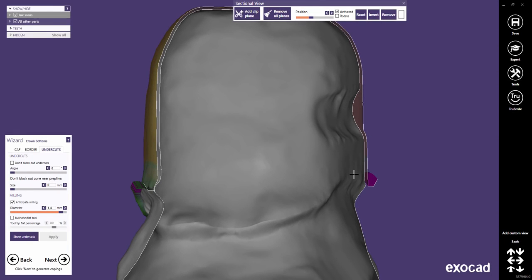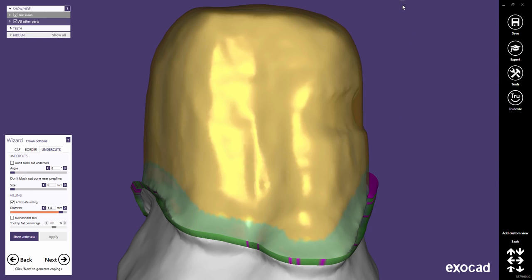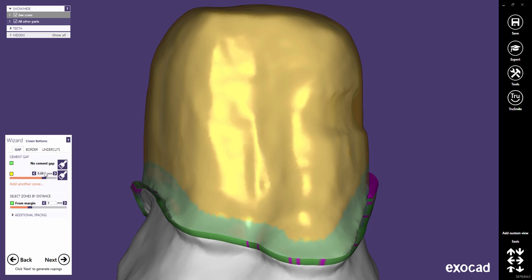As already mentioned in this tutorial, such gaps are to be indicated with magenta color on the borders. Note that computing the blockout of the cement gaps with 3-axis configuration is a computationally intensive operation and cannot be done in real time. Therefore, when adjusting the parameters, you might be prompted to click Preview Result after blockout to preview the result, including the blockout.